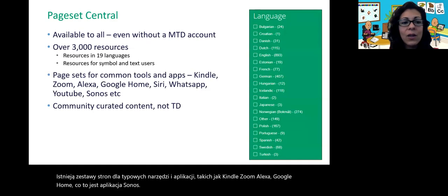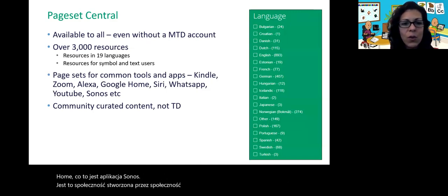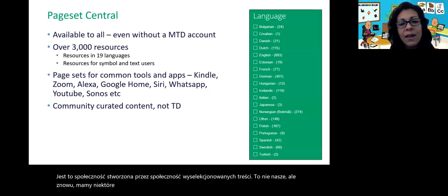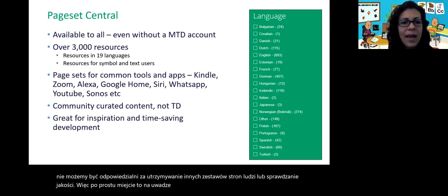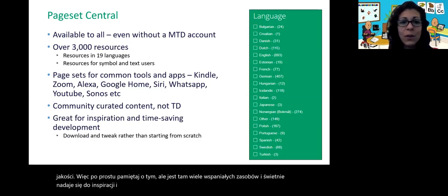It's community curated content. It's not ours, but again, we do have some of our own content there, and there's some really great stuff, but we can't be responsible for maintaining other people's page sets or checking for quality. So just keep that in mind, but there is a lot of great resources out there. And it's great for inspiration and for time-saving development. It's a lot easier to download it and tweak it than it is to start from scratch.